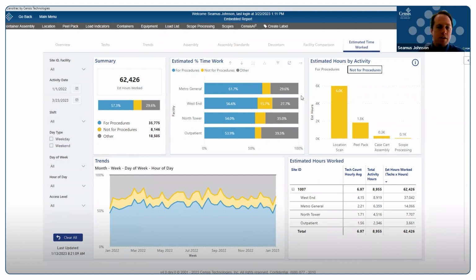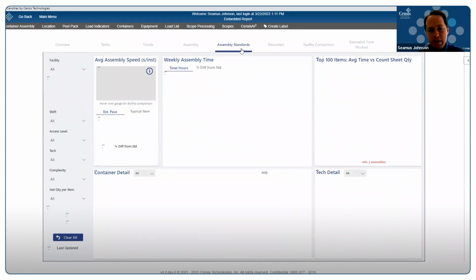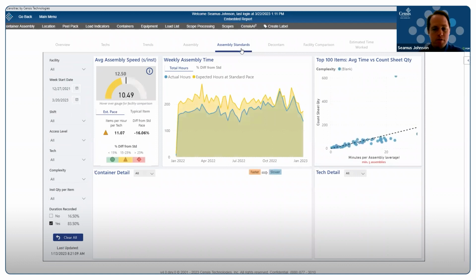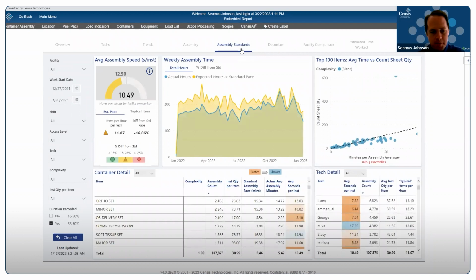The second thing that this module can do to help you improve efficiency is help you eliminate waste in the trays. Everybody knows there's trays out there that have way too much stuff in them, stuff that never gets used. So if you're going to go and optimize trays, that's a big ask. You burn a lot of calories doing that, right? So it's important to understand which trays should be optimized.